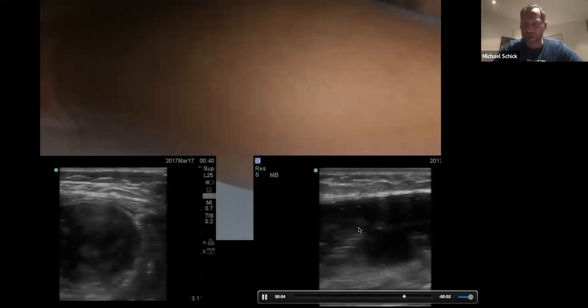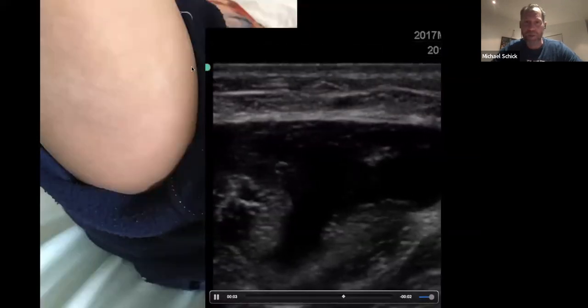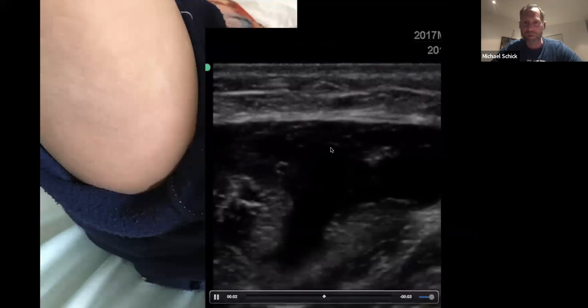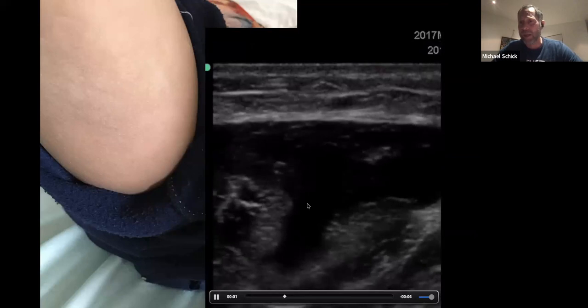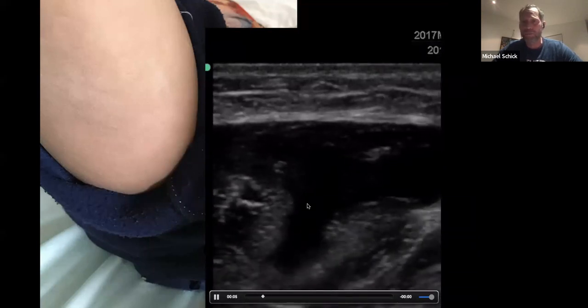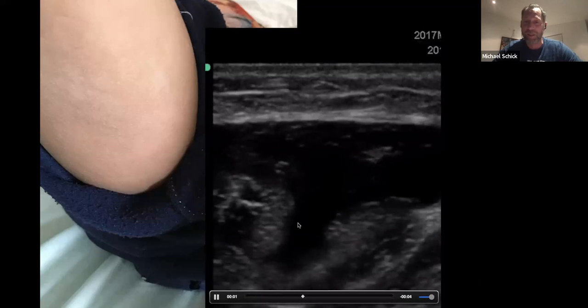And so this child had pyomyositis, and this is another child who had pyomyositis of their hamstring muscle. You can see this anechoic portion within their muscle. These infections are typically just regular gram-positive bacteria. So all these children would respond really well to what we would consider very normal antibiotics, the penicillins, amoxicillins, and things like that.